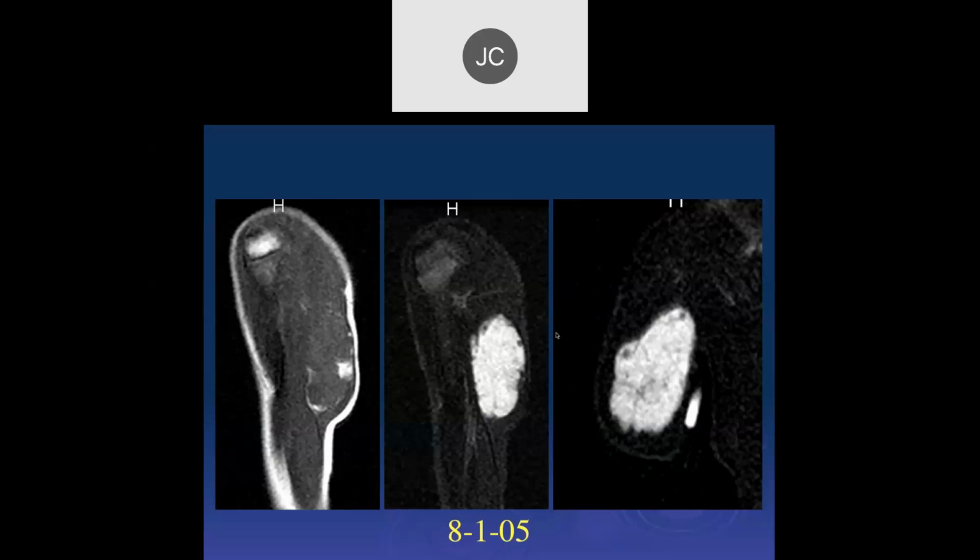Okay, Elior. Okay, so we're in the arm here. Looks like maybe we're within the muscle. This well circumscribed mass. Yeah. So that's the STIR. Very bright signal on the right. Sorry, is that STIR? I think this is STIR, and I think that's T1.